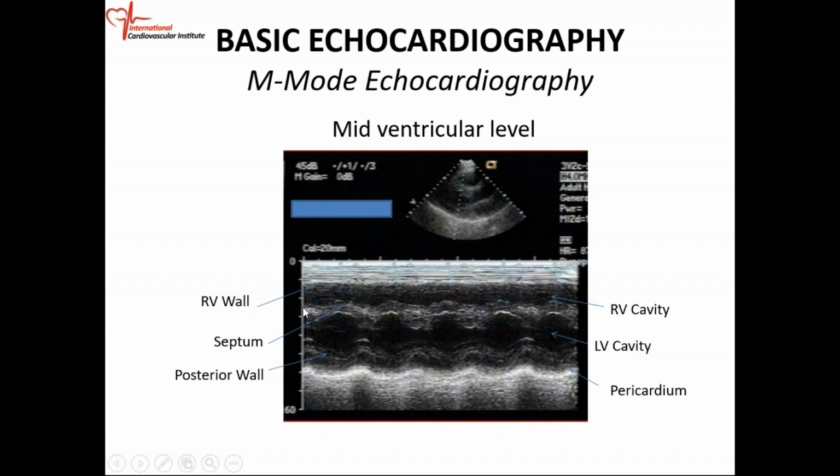So you just measure how thick the thing is, and your EKG, ECG, is on top. Okay. Remember everything is gated, so you can do diastolic measurements and you can do systolic measurements, okay?